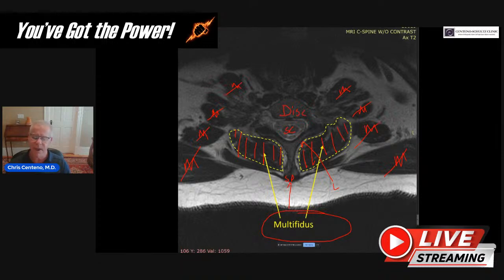Now, I often tell patients to look at this like a steak they would buy in the grocery store, right? So if this is a steak, the area that I have marked in here, forget about all the other parts, but if just this part in here is a steak and you're buying it in the grocery store, you would say that's a good steak, right? It's got a lot of dark muscle, not a lot of fat. That's a steak you'll buy all day long and twice on Sunday.